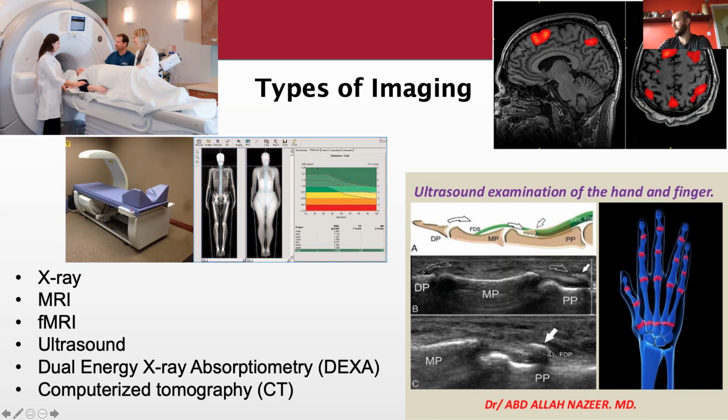You can actually find the flexor digitorum profundus right here, and here's where that fracture piece came off. So it actually came from here, the distal phalange. This is a pretty good picture. Ultrasound, I find, is pretty grainy. It's not that easy to identify, but it's something to practice on, because this is going to become more and more prominent, especially since it's something you can do right away on the field, or just walk them right up into the athletic training clinic without having to send them out for an MRI or anything like that.